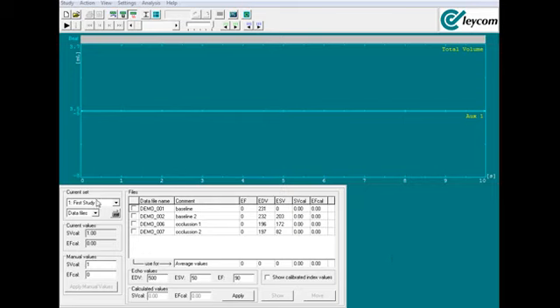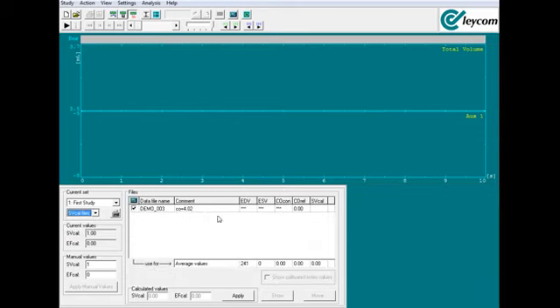Because we're still within dataset 1, let's choose our SVCal files, where here you'll see that moved cardiac output file. The first thing we will do is uncheck the box and enter the cardiac output determined by the external reference in this window.